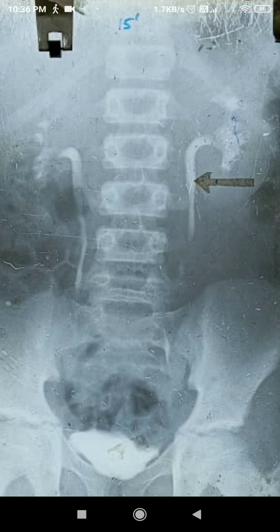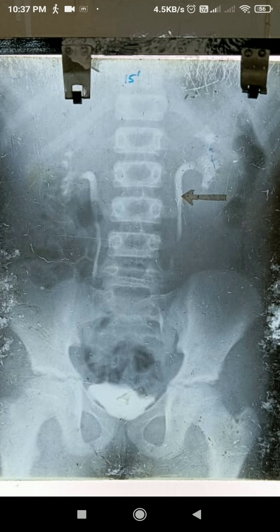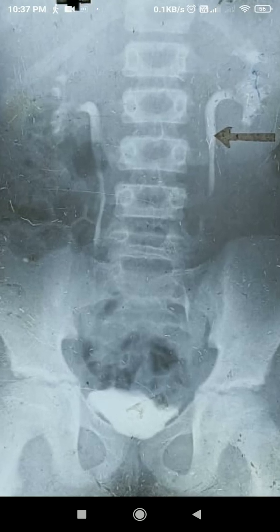the 12th rib. Lower down we can see the sacrum, the two hip bones meeting at the pubic symphysis, posteriorly at the sacroiliac joint, and the femur, where the femur is meeting the acetabulum. There the three parts of the hip bone are not united. We can see the triradiate cartilage mark.